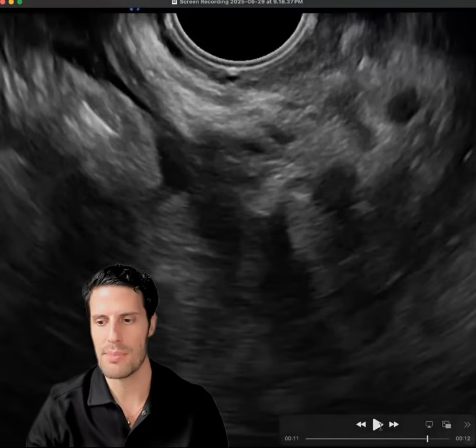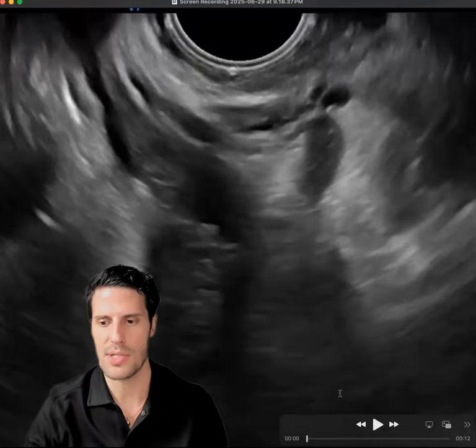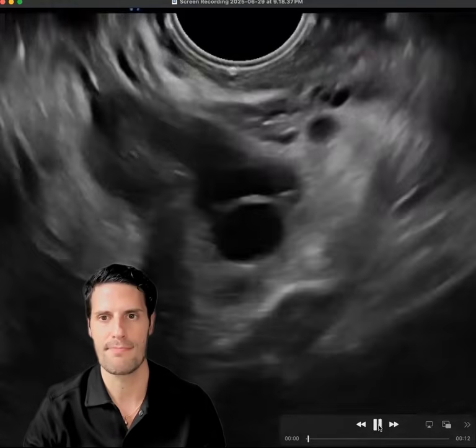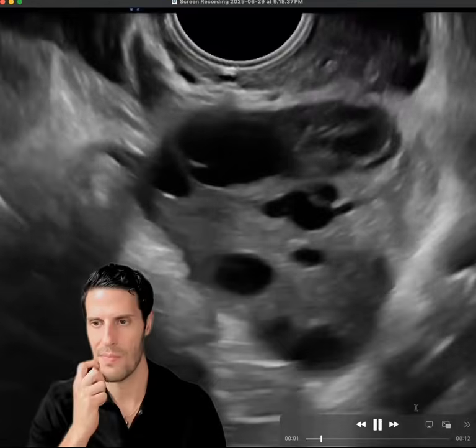My brain is seeing lots of cues when I look at a cine loop. So I want to take you through some of those cues which are triggering my brain to raise flags for abnormal. I'm going to play the clip through a couple times first, and then we'll go through some of the nuanced findings. And I've slowed down the clip so it's playing at 0.5 times the pace at which it was captured.